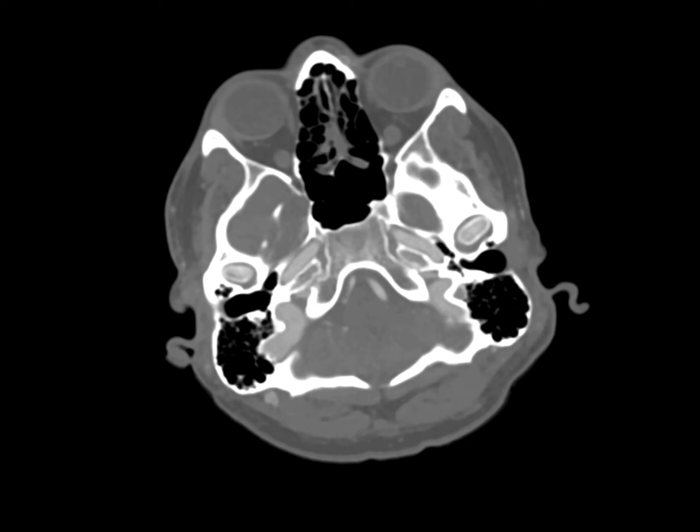One case in which you have a clearly defined caroticotympanic artery will be seen in cases of a persistent stapedial artery. In these cases, a branch is seen coming off proximally and heading over to the middle ear cavity. Let me show you an example of this on a temporal bone CT.